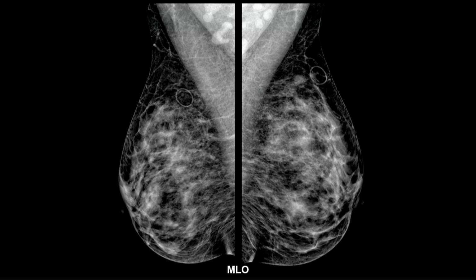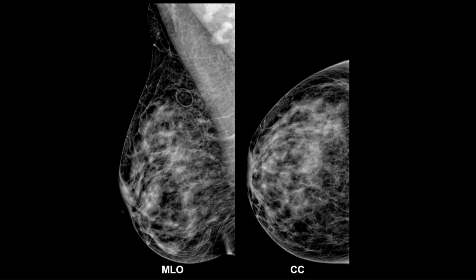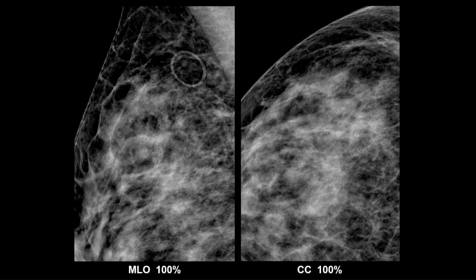This woman has skin lesions, dense breasts, and in this breast has calcifications. You're not going to see them yet, but maybe here you can see them a little bit better. They're right here, and they're right here. And if you're close enough, Mike, can you see them? Yeah, okay. Well, if you don't see them, you should be sitting next to Mike.